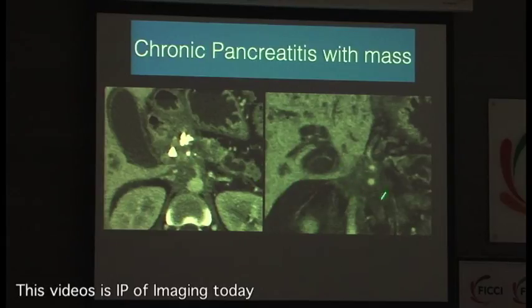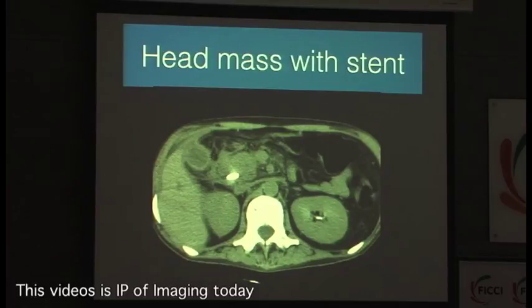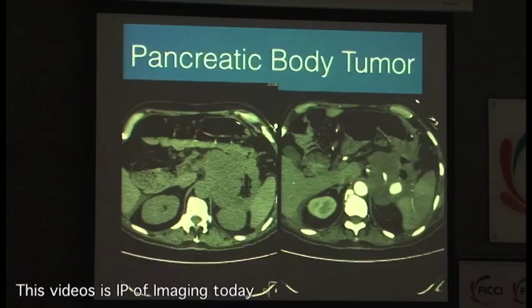And this is what kind of spread? This is all perineural, correct. So the tumor was a little far away and all the tumor came along the perineural region. That's great. One more thing is, if you have a surgeon who does talk to you, you can tell him to get a scan done before you stent the patient. Why? Because they cause pancreatitis many times, and they smudge up all the fat, and that's not very good as far as the accuracy of diagnosis goes, right? So try and keep the procedures for after the imaging.